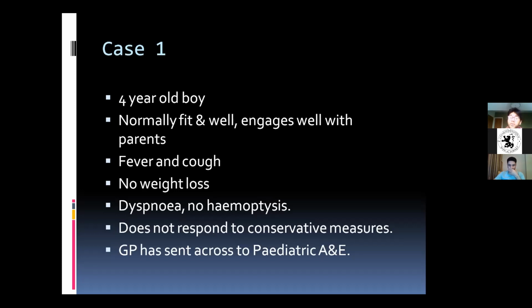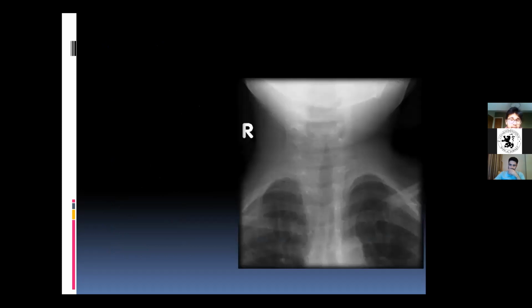The GP was like, okay, you know what? You need to go to pediatric A&E. And the pediatric A&E shows this kind of an X-ray. Now, this is obviously zoomed in, okay? Anyone know what you're looking at over here?